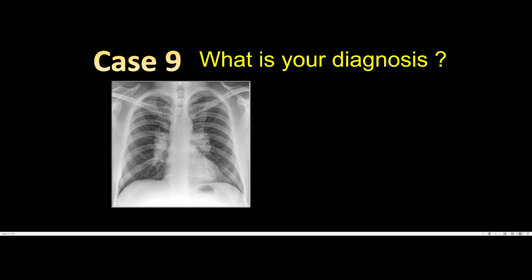This is an obvious finding. My diagnosis, or my incidental finding, is that this patient has everything normal, except for the finding of bilateral hilar lymphadenopathy. So the hilum, as you know, consists of veins, arteries, and nerves. The hilum is composed of your lungs within the center. And obviously, what might be obvious here is that the lymph nodes specifically, which are also present in the hilum, are enlarged. So if you have enlargement of the lymph nodes within the lungs' hilum, on the right side and the left side, you start to think of a lot of differential diagnoses. There's no specific diagnosis. You need to narrow it down by ordering a CT scan.